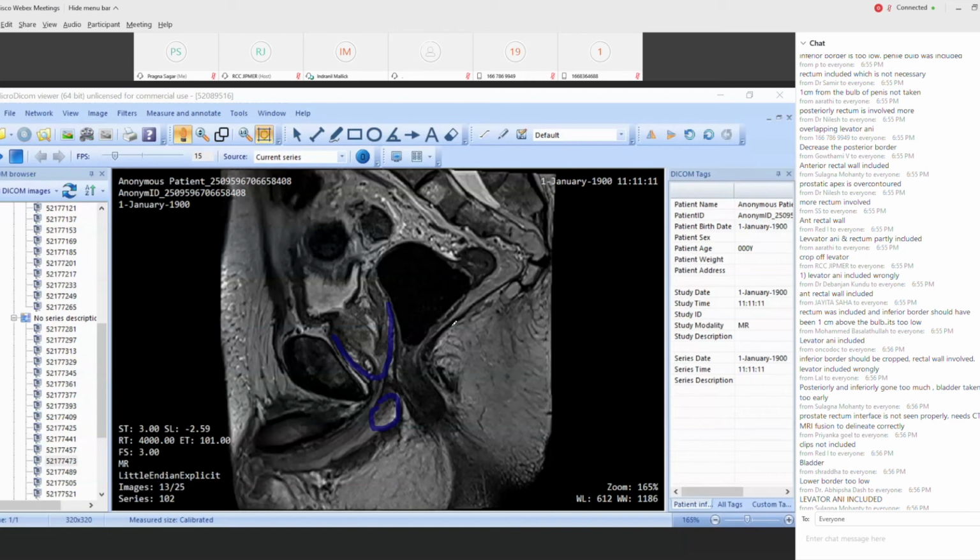However, in the post-prostatectomy setting, you don't have much option because you have to take into account the urethrovesical anastomosis. So you really need to make sure that you come down up to the top of the penile bulb. So part of the urogenital diaphragm will get covered. Anyways, it is weak in these patients post-prostatectomy.